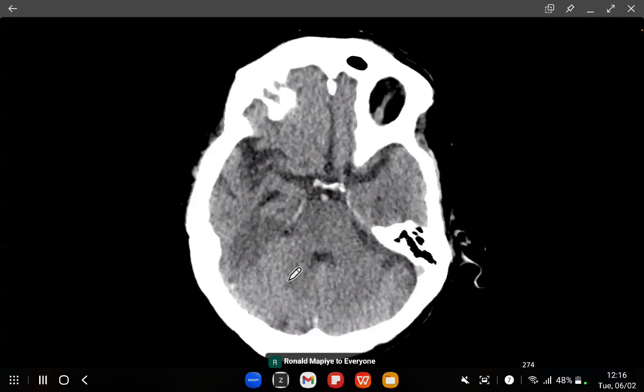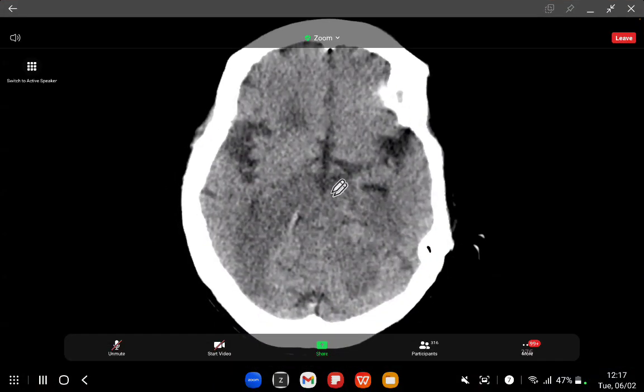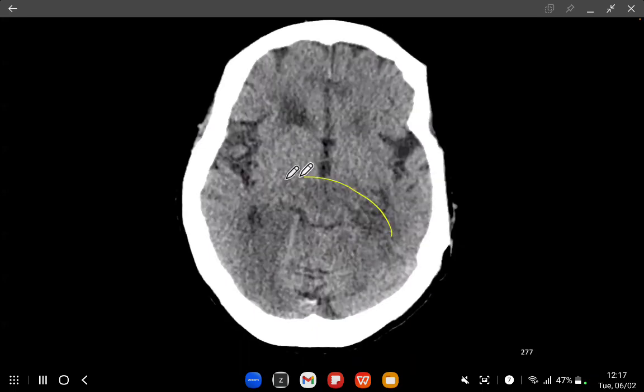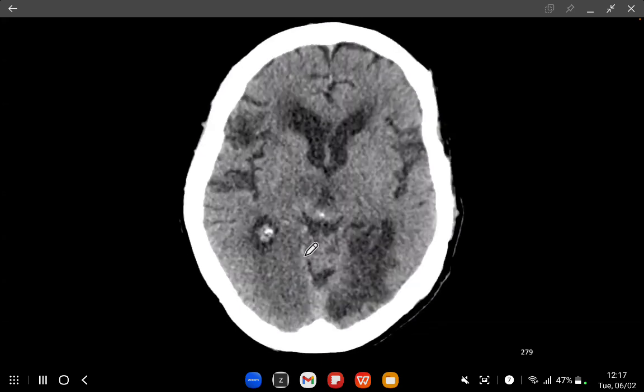Okay, this patient presented as a stroke, and his GCS has gone from 10 to 3. And what can you see? Yeah, basilar artery thrombosis. You can also see some low attenuation change here. And this patient has got posterior territory infarction and probably would not be a good candidate for thrombectomy. But always worth having a discussion with the clinician and the neuroradiologist.